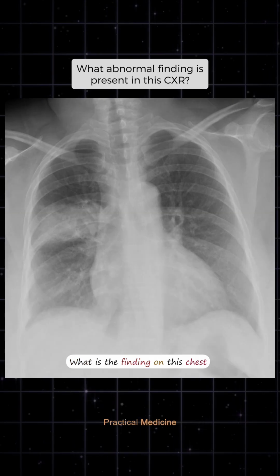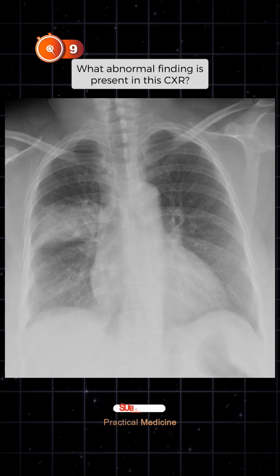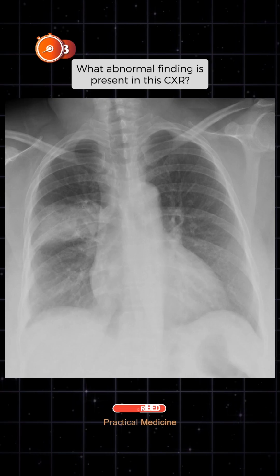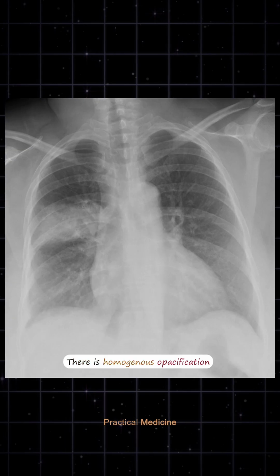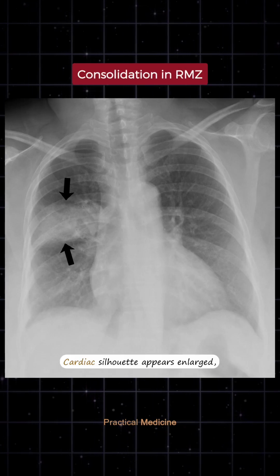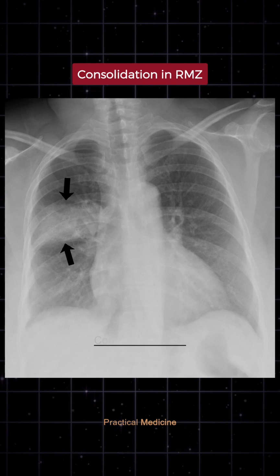What is the finding on this chest X-ray? The patient has fever, cough, and pleuritic chest pain. There is homogeneous opacification with air bronchograms in the right middle zone of this X-ray. This is lobar consolidation. Cardiac silhouette appears enlarged, but this X-ray is taken in the supine position and is an AP view.